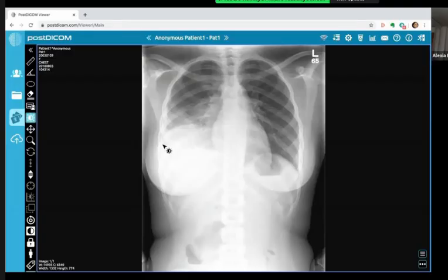Yes, but we know that there is an effusion, isn't it? Because the right hemidiaphragm is obscured. Okay, so right lower zone pneumonia with an effusion, possibly a parapneumonic effusion. Yes, so that was the initial presumed diagnosis. She was started on antibiotics. She was not getting better.